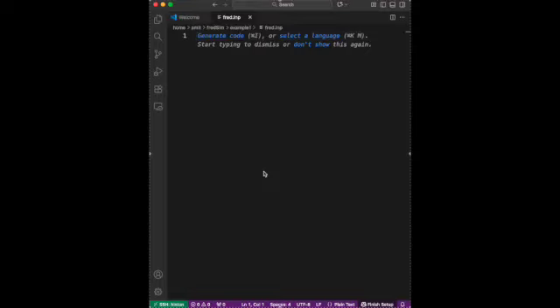In the previous video I was not quite clear and there was a lot of confusion. I hope I'll be able to clarify this time. I'm going to write the code again. So first I'll define the phantom region.